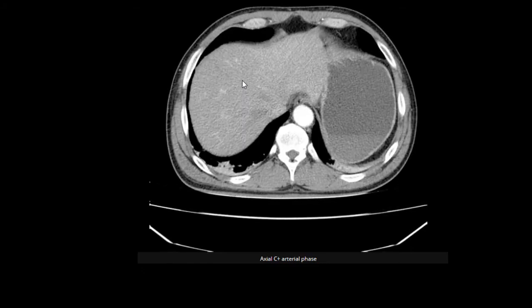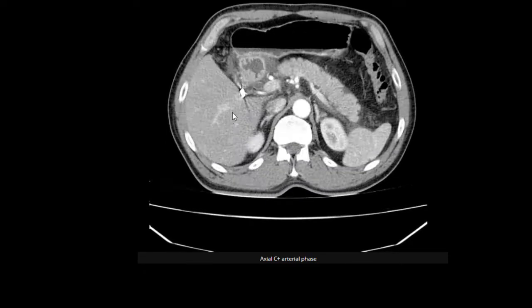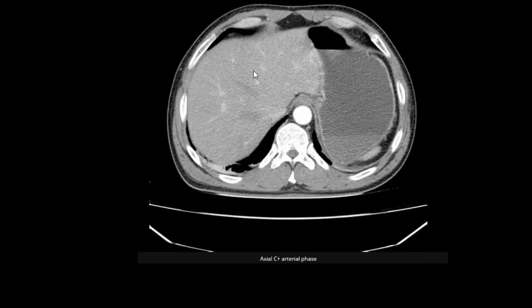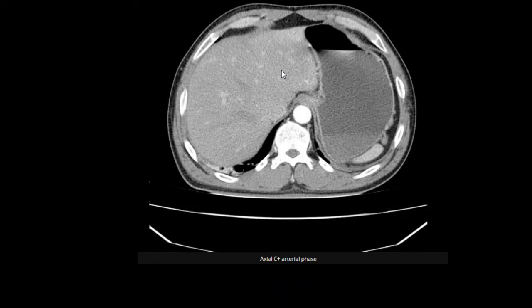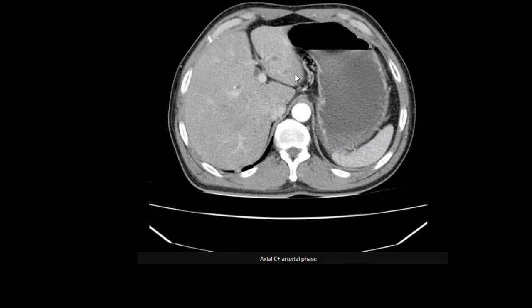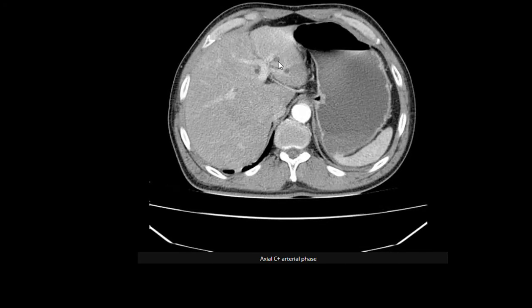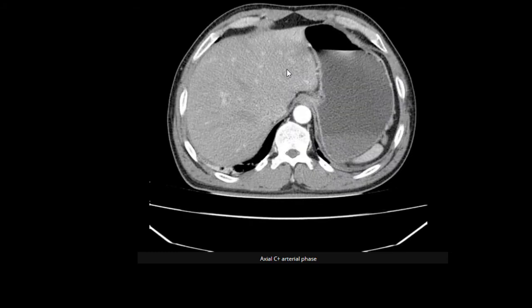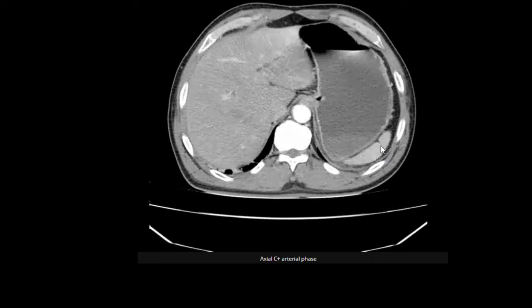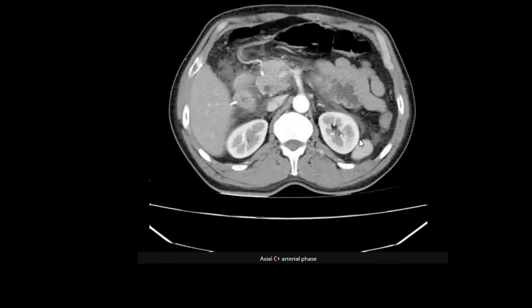We start off with the liver, looking along the right hepatic lobe and then along the left hepatic lobe. We do see a few sub-centimeter hepatic hypodensities, which are too small to characterize and most likely benign. They do appear to be in continuation with the biliary system and may just represent some focal biliary enlargement. We'll move next to the spleen, which appears normal.